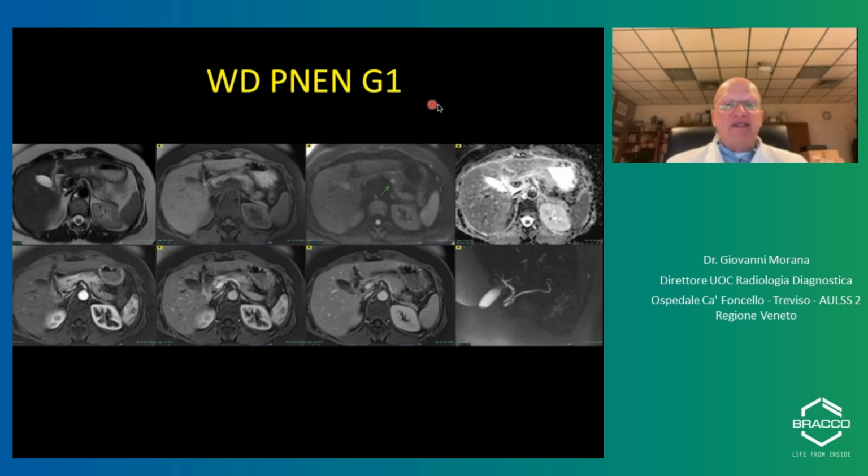Sometimes when the lesions are very small, we can only appreciate them with a good diffusion weighted imaging, like in this case. This was a G1 PNEN.